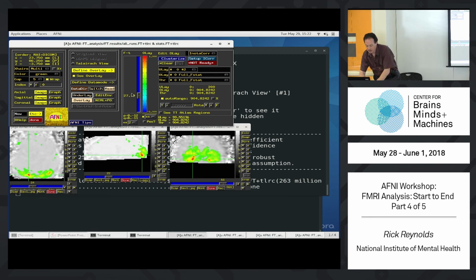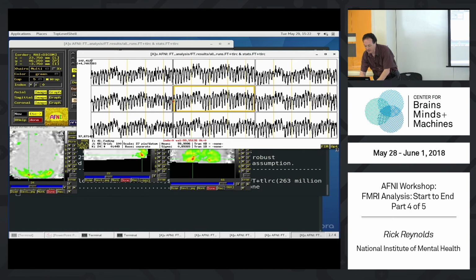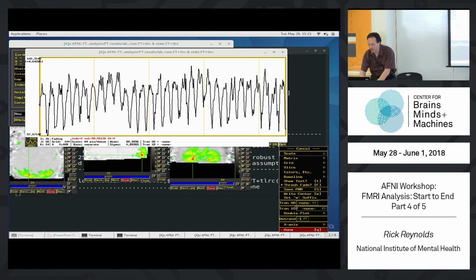And open up a graph window. So we're at a voxel with a really big FSTAT. And remember, I'll go to the opt menu and we can do that double plot thing to see if our model fit to the data. So we can hit opt in the lower right corner, and then under tran1d, there's that dataset number n plugin.